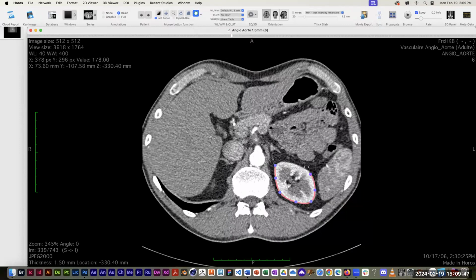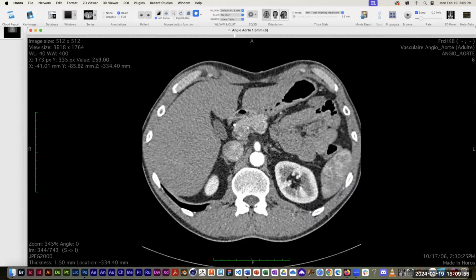It's like most things, with a little more practice, you kind of start to understand where it's going to draw the curves. So you can put the points in the right places to get the kind of curve you want. But it's not super intuitive. It's not very intuitive.